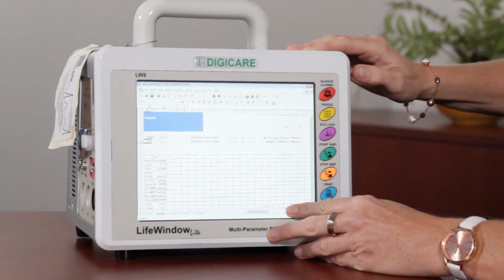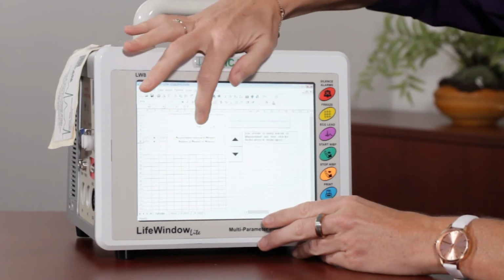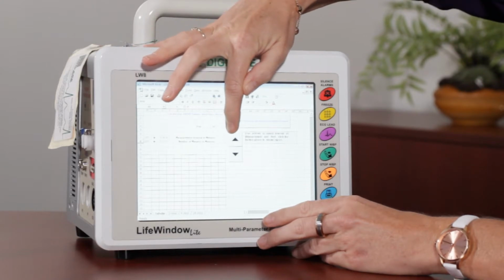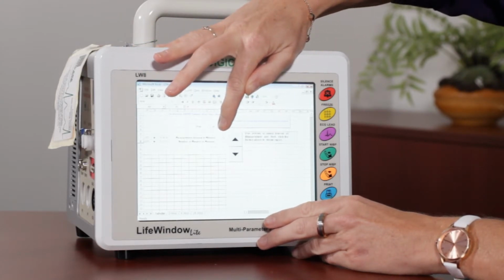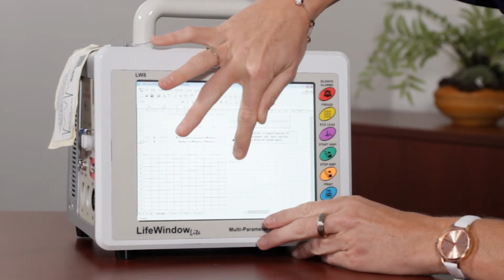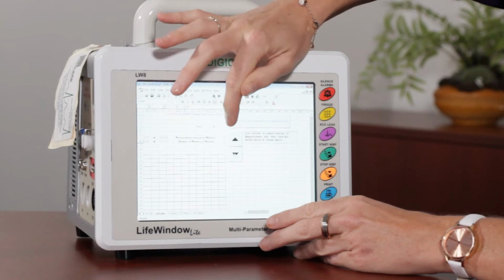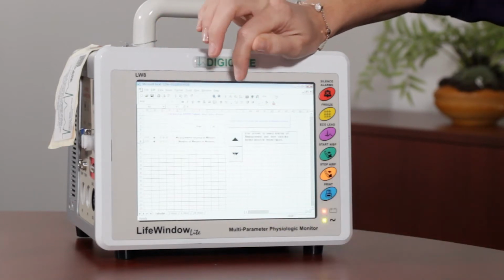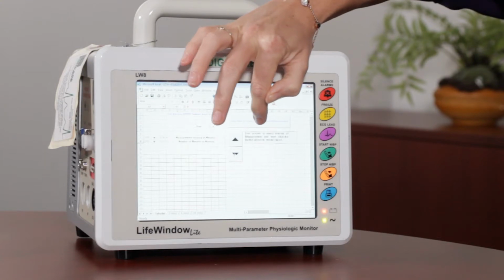It automatically defaults to save every 5 minutes, but you can change that interval of time by scrolling over. Here it says measurement interval in minutes is 5. If you wanted to change that, say you did have an event that you wanted to see, you could decrease this time by hitting the black arrows. Say you wanted to do every 1 minute, then you'd hit click here to renew interval of measurement.